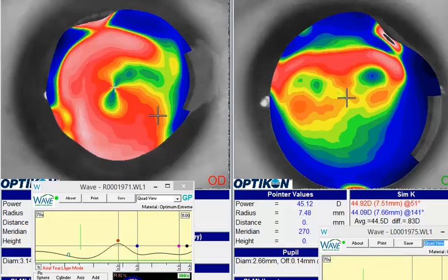I see from your clinical request you're struggling with the fit, in particular on that right eye. It sounds like the left eye is fitting reasonably well. So let's talk about the designs for a moment. If we look at the right eye, as you know, you have quite a bit of irregular corneal contour there, and unfortunately you don't have a whole lot of peripheral data captured on this design, and sometimes that happens with these highly irregular corneas.